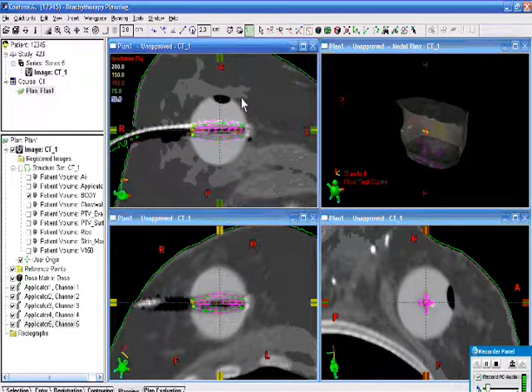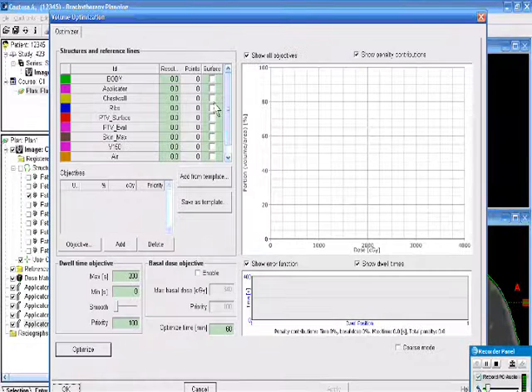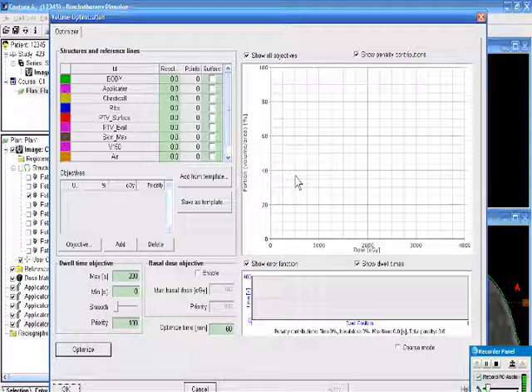Now there are a number of ways to do the optimization. I'm going to show you my favorite. The volume optimization is likely to get you a very good result every single time, and I recommend that you use this primarily. You may want to make some modifications to it by hand later on, but the chances are that you will make some parameters worse when you do that.